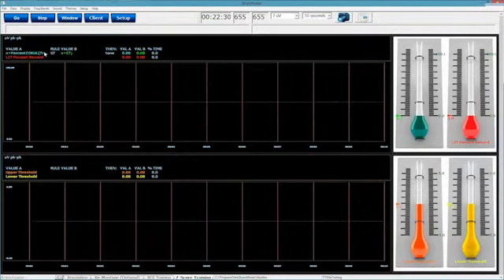This is another reason. For those of you who are used to the software, one of the things you always notice is that your patients are seeing all this gobbledygook, which means absolutely nothing to them. By putting a name in, we clean that up. All they know at that point is that it's training. They don't need to know that we're looking at the percent ZOKUL, train T, and that this is greater than that.